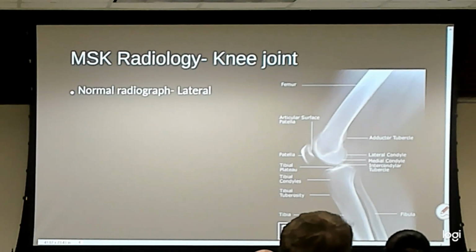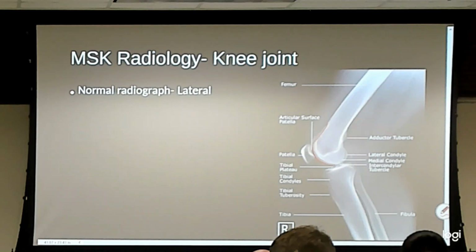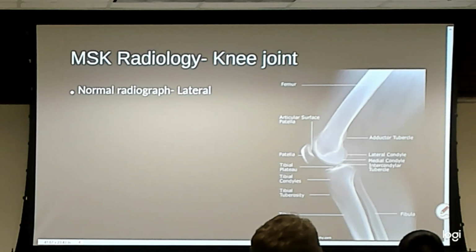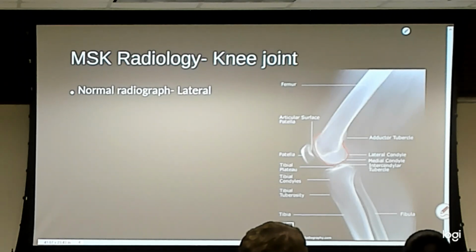From there, we move to the lateral of the knee. In a well-captured lateral, both of the femoral condyles should overlap. Here, they're not perfectly overlapped. You can actually see both of them. But it doesn't mean that you know which is which, so don't go jumping to that conclusion. But here are those overlapping condyles. I think on your picture they're a little better overlapped. See?